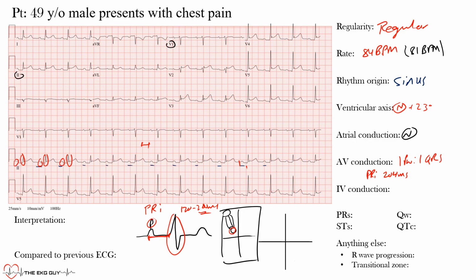Okay. All right, next we're looking at intraventricular conduction. So again, we made our way through the AV node, and now we're looking down here into the ventricles. Now, intraventricular conduction is, first we want to look, is the conduction within the ventricle prolonged? Meaning from beginning to the end of ventricular depolarization, normally it should be between 70 and 110 milliseconds, at least less than 120 milliseconds. In this case, we certainly have that, okay? Now the QRS duration that was measured by the machine was 98 milliseconds, so we'll call that normal.